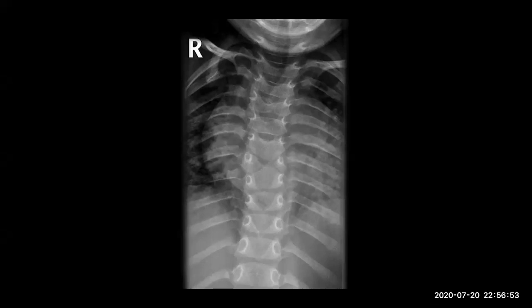Abnormal vertebra. Butterfly vertebra. Yes. Which level? Thoracic, sorry, T7. Anything else? Cardiomegaly.